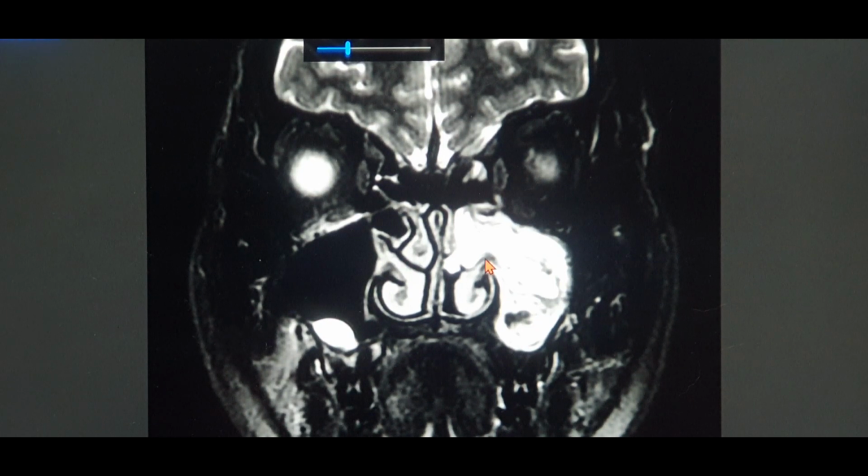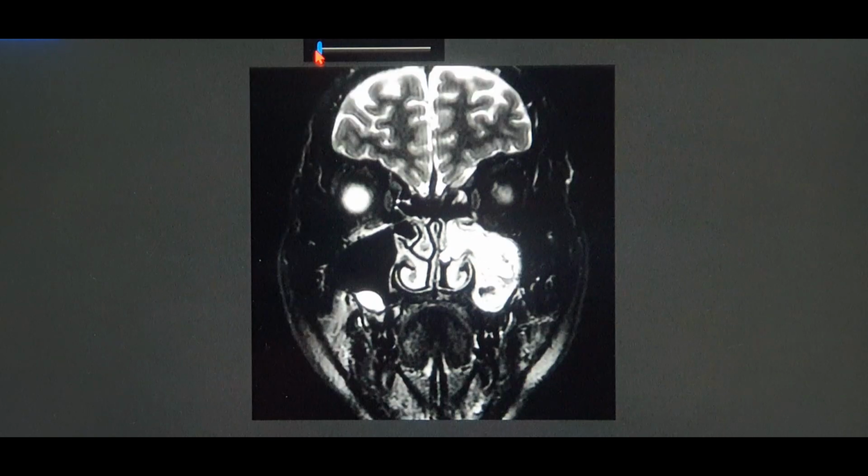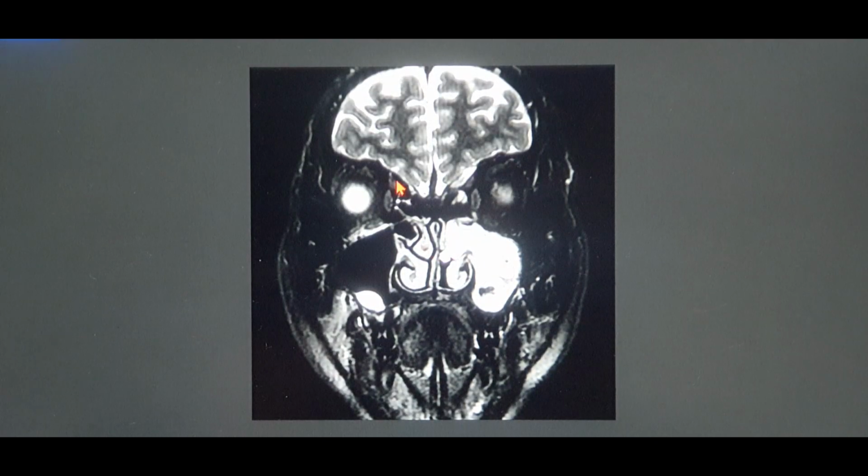This is just normal T2. As I said some time back, on T2 it is generally hyperintense to muscle, and the same thing we can see over here. This is hyperintense to the muscle, and this is the inverted papilloma with the alternating hypointense bands.